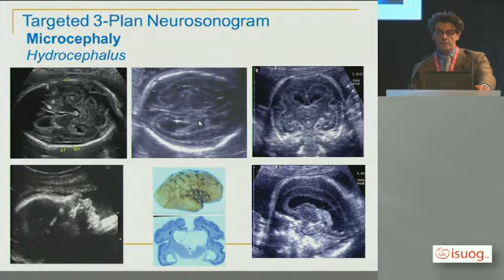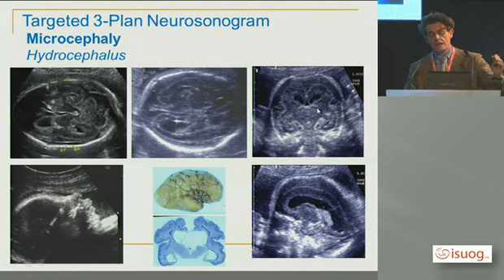So if you start from there, you would see that not only is it a small brain, but the germinal matrix shows a small periventricular cyst, that the echogenicity of the white matter is heterogeneous, that there is some hyperdensity at the lower end of the ventricles, that the choroid plexus are very bright, very small towards the lower part, and that again the germinal matrix is all blown up with a small cyst here.